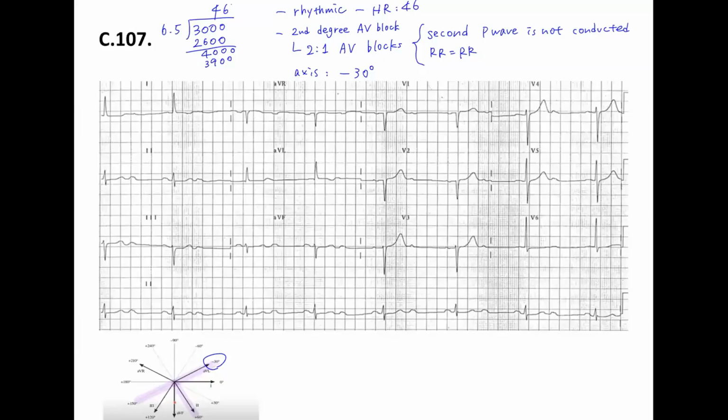Yes. Well, it is rhythmic, and the heart rate is about 46, and it is second degree AV block, and it's 2 to 1 AV block because every second P is not conducted.